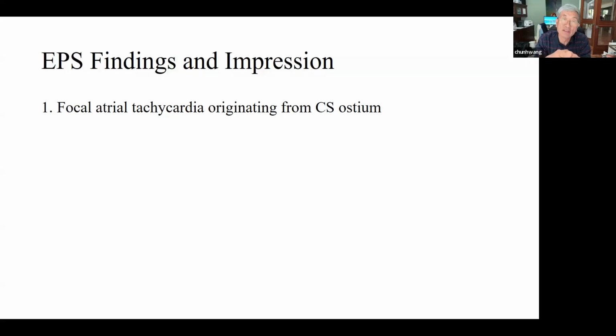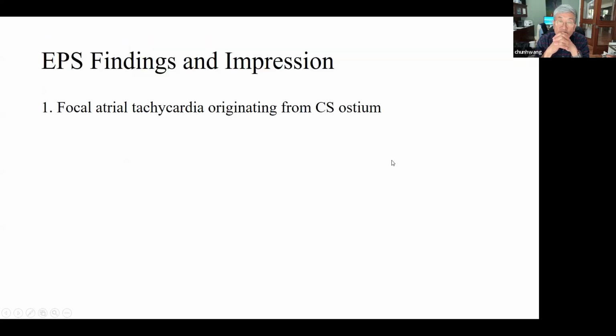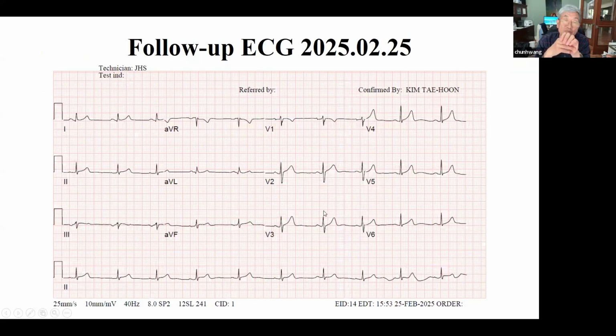Lastly, why did the patient have right bundle branch block? Is it rate-dependent aberrancy? Initially, the tachycardia EKG. Look at the V2 ECG. Now look at the sinus rhythm. Okay, go back to sinus. What other change do you see? I think maybe the rate dependence. Yes, the QRS also normalized pretty much, right? Normal, no right bundle branch block.